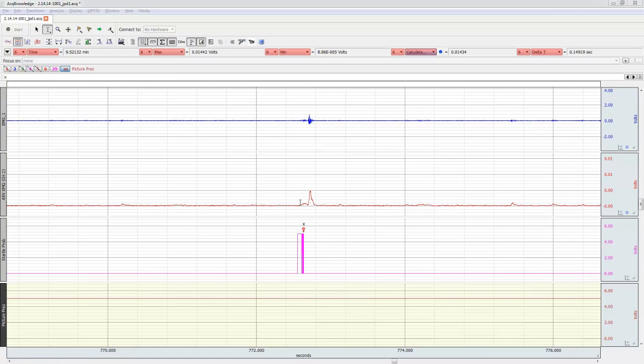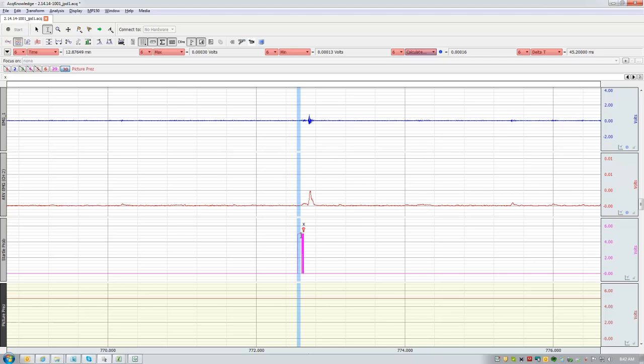Okay, here's another trial that we have to take into consideration. We know our startle probe was administered here. It was initiated. Now you see this little bump that's occurring prior to when we would expect the startle response. That means that a natural blink began at a point where it isn't directly related to the startle probe. This could theoretically take away from the amplitude of the startle. So we need to consider whether or not we're going to reject this trial because of this natural blink that occurred during a period of time that is not related to the induction of a startle.